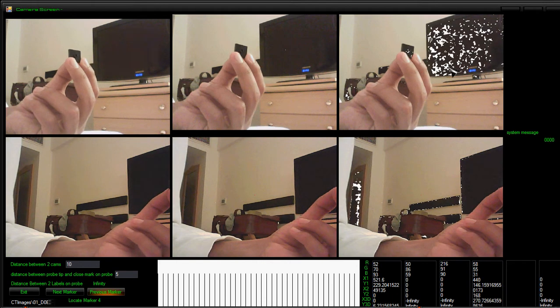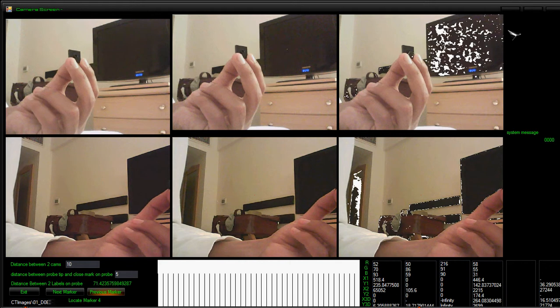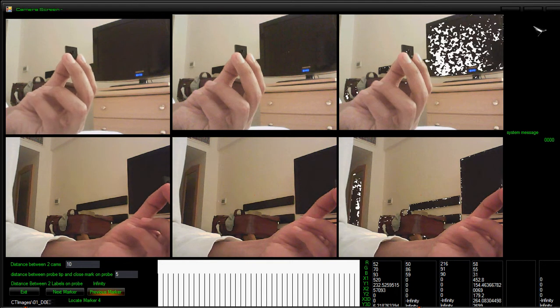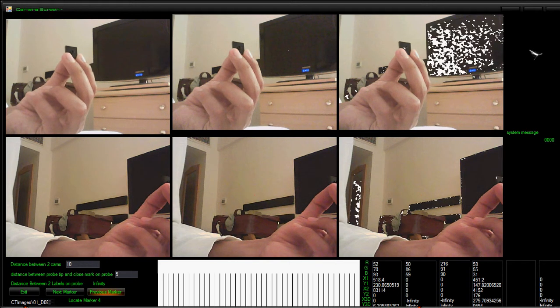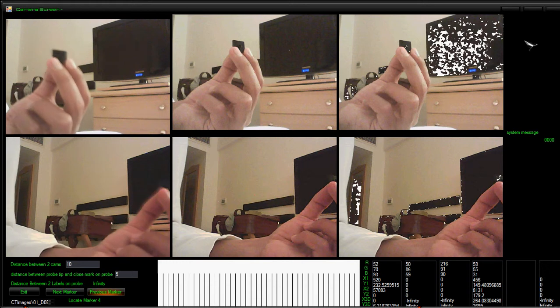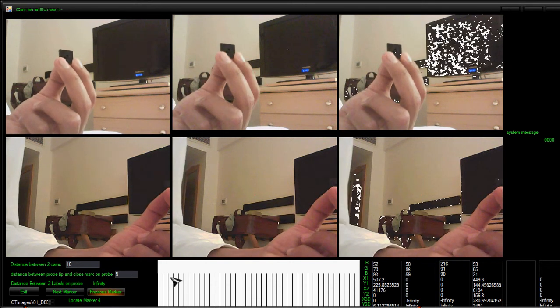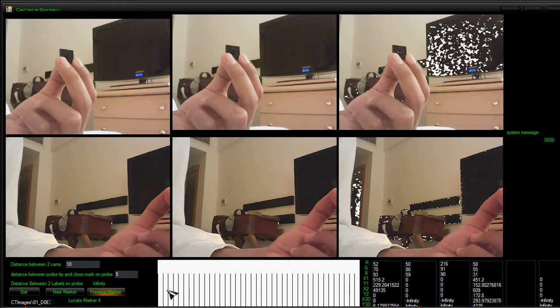What's gonna happen next is when I move the probe inside the CT scan, the scans that are being cut will appear here on the right. Now since I don't have CT scans with a probe and the equipment, I can't test it. And down here, okay, those are my 37 CT scans.